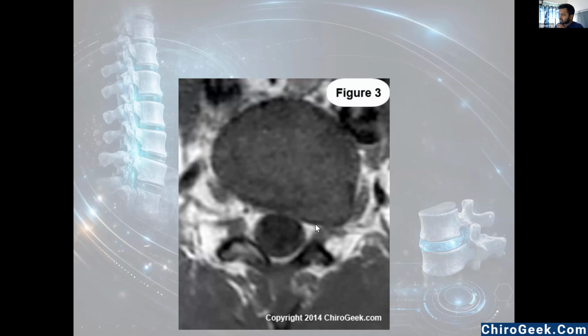But here, if you see, there is a focal outpouching. The space on this side is normal, but on this side it is getting obscured. So there is a focal outpouching. A large lateral foraminal herniation has happened, and this is obscuring the exiting nerve. Here you can see the spinal canal is dark, so it is T1 imaging.